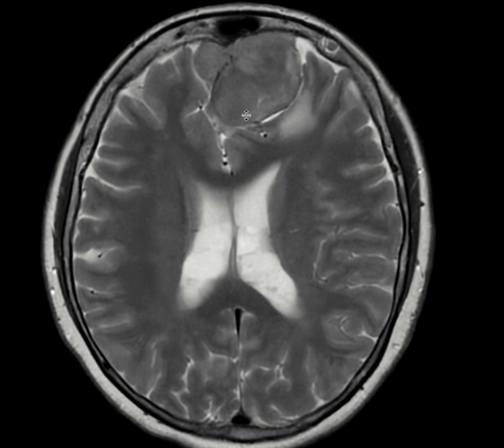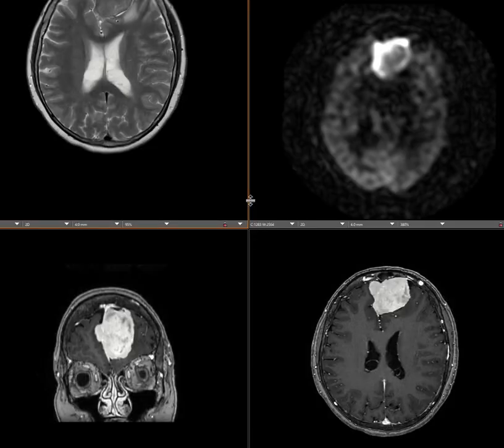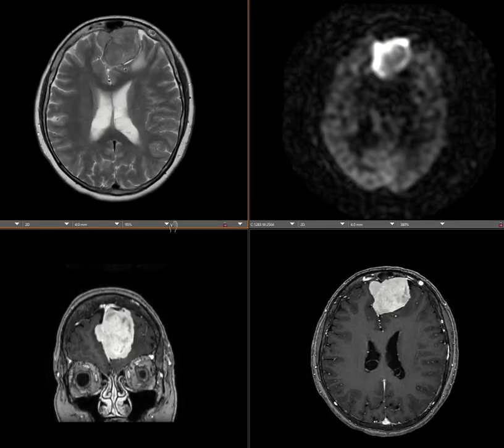So these lesions have different grades. Meningioma has three grades. When we get to more atypical meningiomas, we're going to have more invasion, or they are more aggressive, and they cause some edema in the adjacent white matter of the brain. Okay, because we just discussed meningioma, let's look at some imaging features of meningioma.